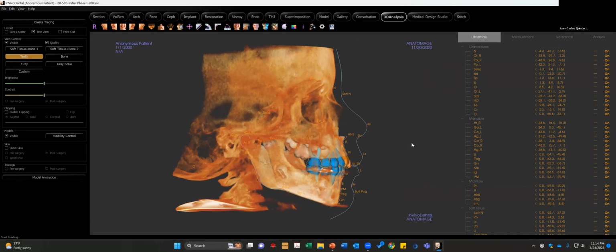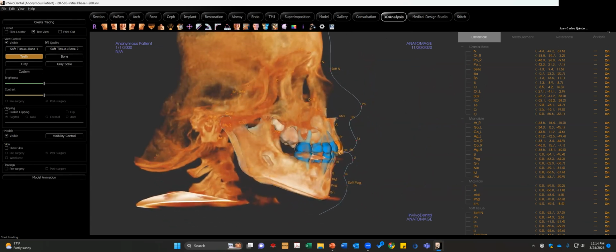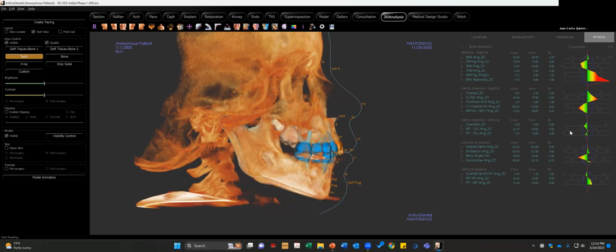It's the 3-dimensional cephalometric tracing. Okay, so they would trace the ceph for you, and the software has many different types of analysis in their library. My particular analysis of choice is the Bjork analysis. I also have a WITS analysis for those who know that. So you can certainly customize, mix and match different analyses with different values. So you could have a Bjork, kind of like I do with a WITS, and you can add Steiner, Sassoon, whatever it is you want.